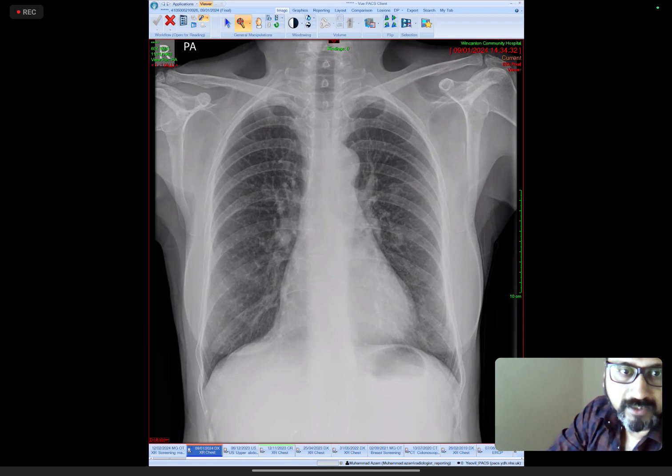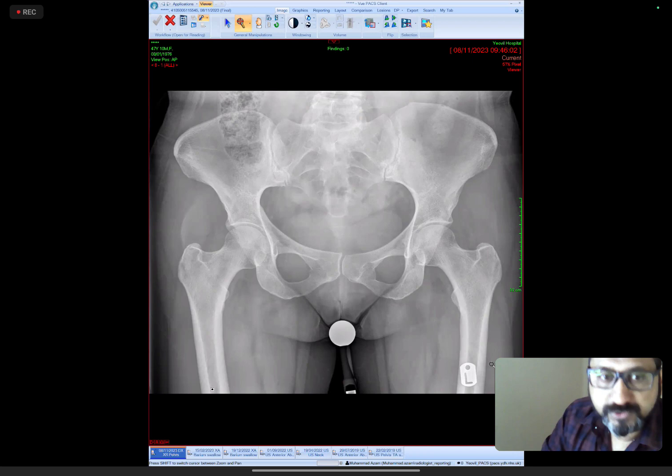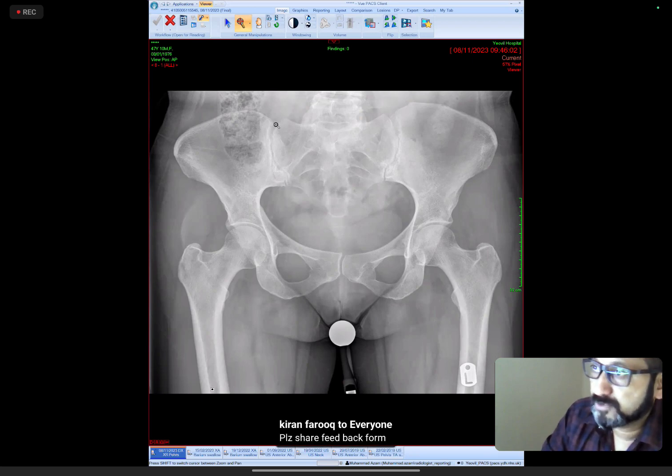And then RR8 and 7. I would appreciate if you people would give me feedback for this session, and that is almost 2:30. What was that case? Sorry, it was case number 8. Any query, please write down in your chat box. So I would address. Absolutely normal from everywhere, and I could see that mostly people have written normal. So this is a normal X-ray.